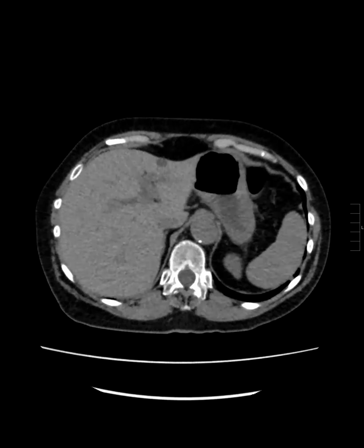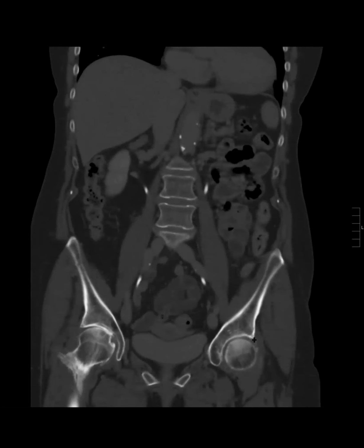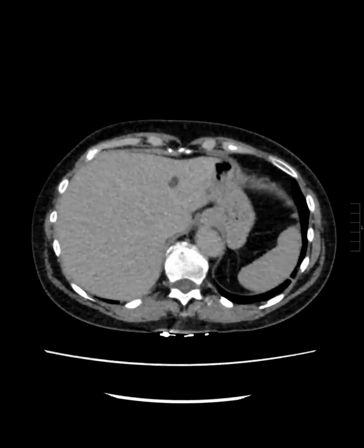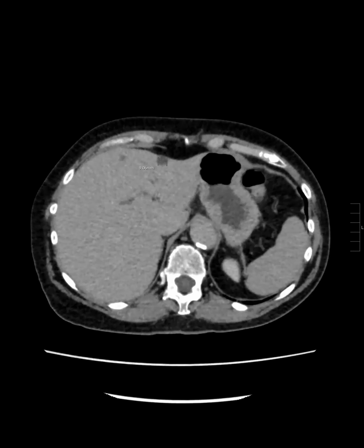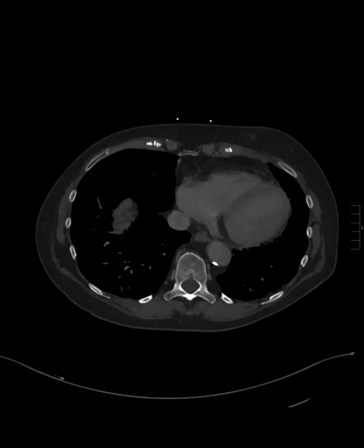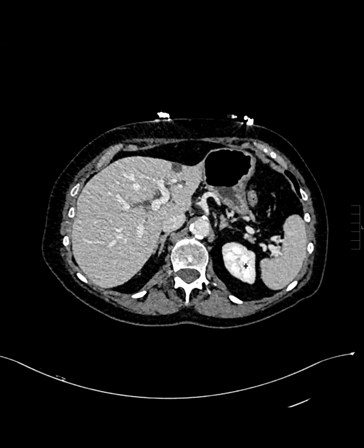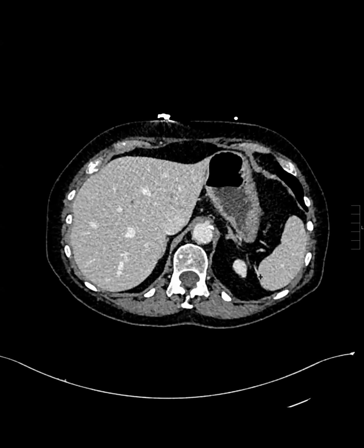We astutely picked up this area in the left liver that's a little atrophic. Here's a better one. This was upon presentation to the ER after a motor vehicle accident, and we astutely picked up these findings in the liver.